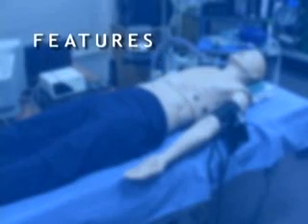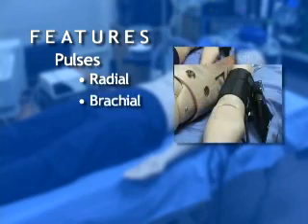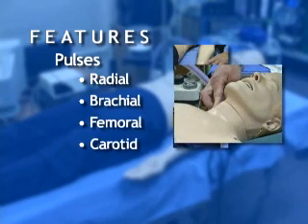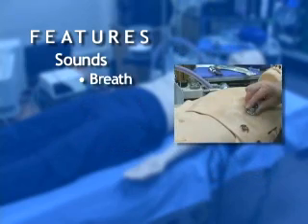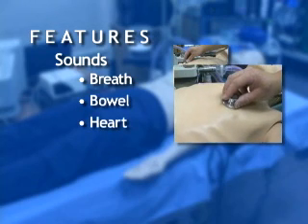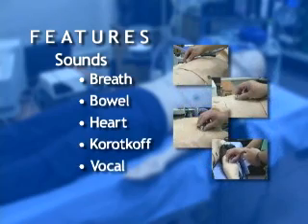SimMan has a remarkable set of features. He has radial pulses, brachial pulses, femoral pulses, and carotid pulses. He has breath sounds, bowel sounds, heart sounds, Korotkoff sounds, and vocal sounds.